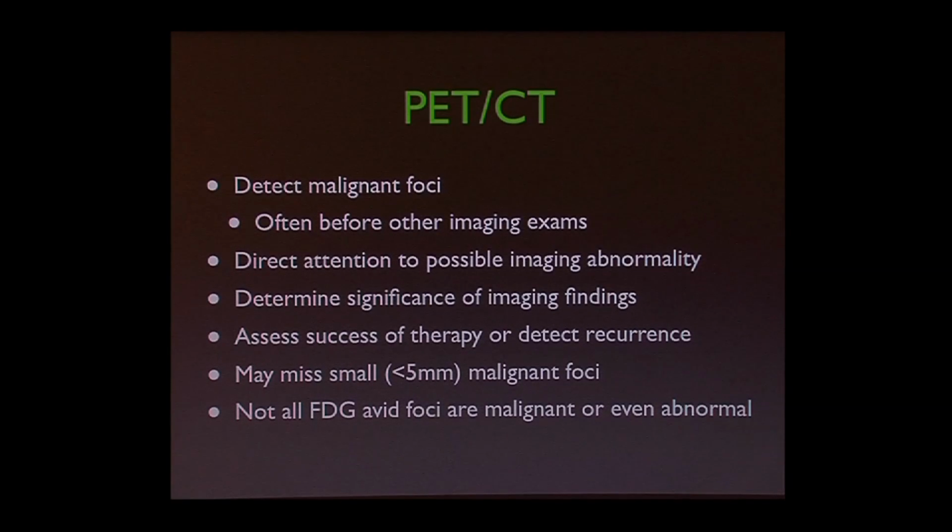Well, now they're all in one system. So while the patient's on the table, they get a PET scan and a CT scan. I know exactly where everything is anatomically. That's called PET CT, and it's good for a lot of things.